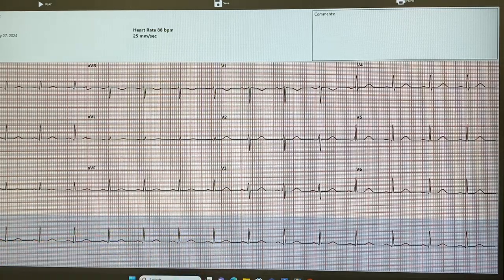So then what problem is it if they are too long or inconsistent? You guys know? AV block. Right? You're not worried about an AV block if the PR interval is normal, if it's not prolonged. All right, and then what do we look at next?